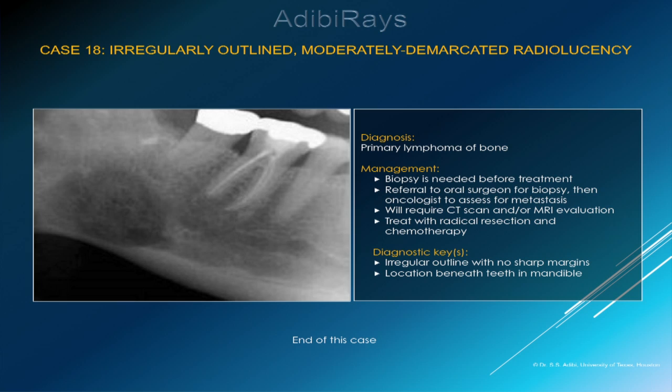Key diagnostic features are irregular outline with no sharp margins, located in the mandible, periapical to teeth, and with no relation to them.